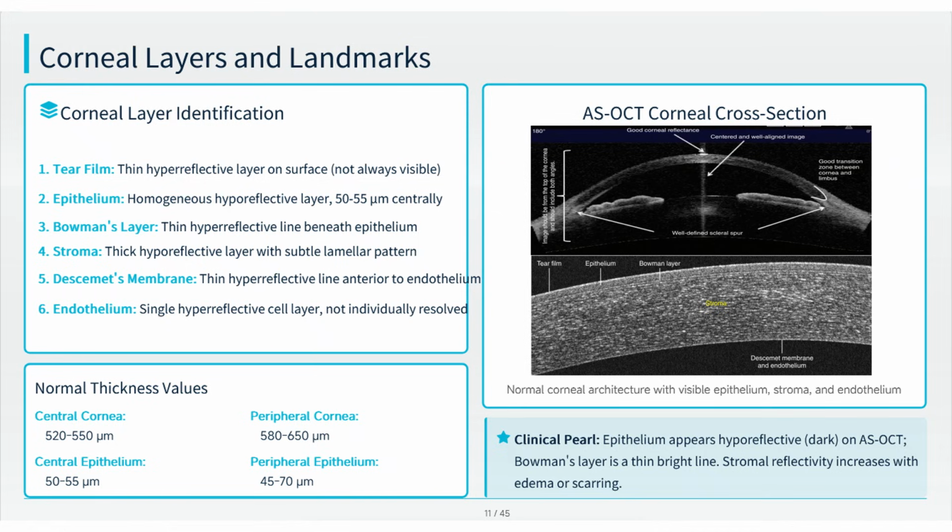When you see the OCT map, this is a two-dimensional construction of the anterior chamber and/or the anterior segment. You can see the cornea, the anterior chamber as well as the iris, and you can see only the central part of the lens, because the remaining parts are hidden behind the iris, and as you know, the iris is lined by pigmented epithelium, so the rays cannot penetrate here.